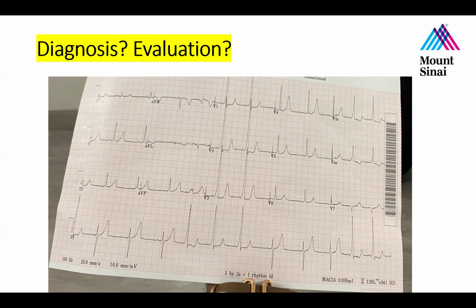It just means the ventricle is refractory and therefore you're not seeing pre-excitation. So when I see intermittent pre-excitation in someone asymptomatic, if it's left-sided, I am much less convinced of the low-risk connotations that the 2012 recommendations would make than if it's septal.